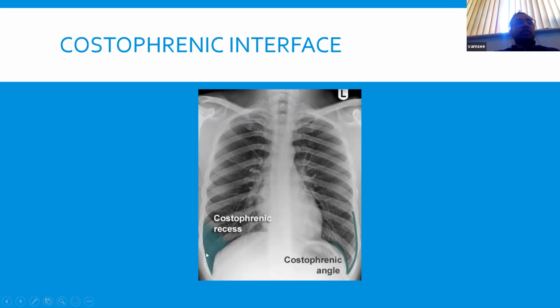So this is a very sensitive indicator of if there is a pleural effusion, and that's why that's quite important. So we refer to it as blunting of the costophrenic angle, because you're meant to see this nice sharp outline going all the way down, and if that gets obliterated, you're concerned with fluid again.